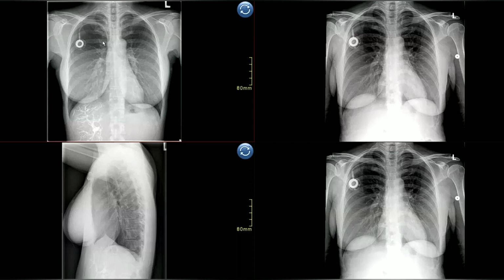They did that, and this is a porta cath. Yeah. So you just need to be well versed with tubes and lines. As soon as you see this porta cath, you should know she has a malignancy. You just have to say female. You could say breast. What other most common is colorectal. And we do chemoembolization of colorectal. It could be HCC, very rightly said. They could have done chemoembolization for that, but this was colorectal. Very good.